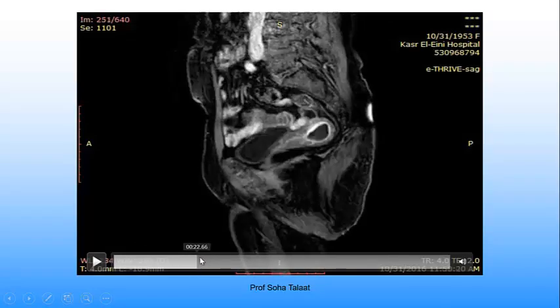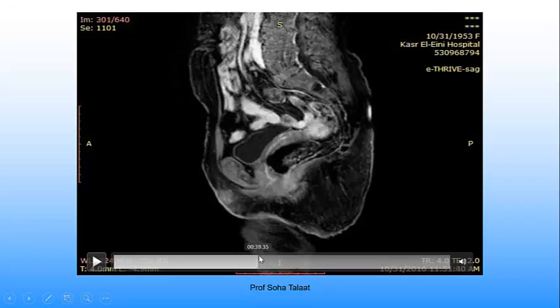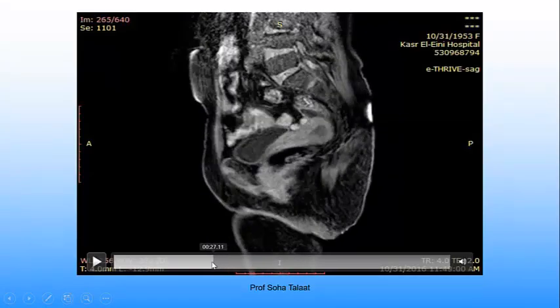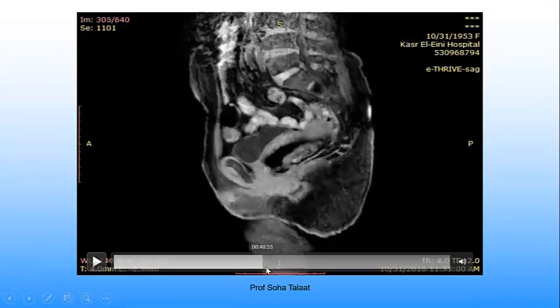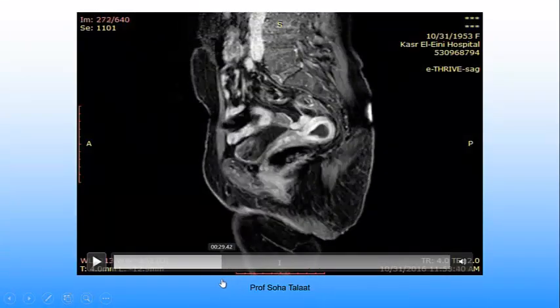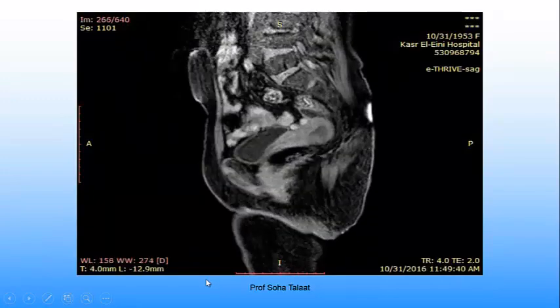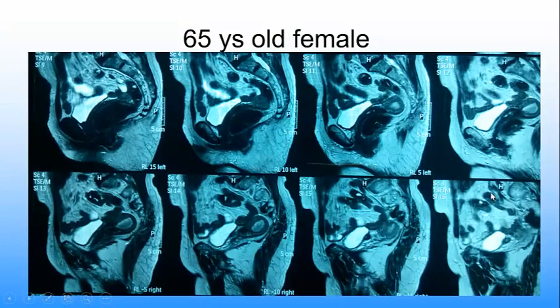In endometrial lesions, you must take contrast dynamic. Here the lesion is not taking contrast enhancement at all. In the early stage, there is no contrast enhancement. Starting in the delayed, I will show you a picture in the delayed image afterward. Here is the lesion.